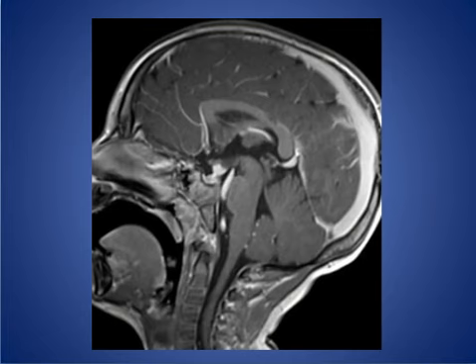Next case, a 4-year-old child with diabetes insipidus. What could be the cause in this sagittal MRI T1 after contrast weighted image? We see an enhancing mass in the region of the pituitary stalk, and the patient has diabetes insipidus, and this is highly suggestive of Langerhans cell histiocytosis.